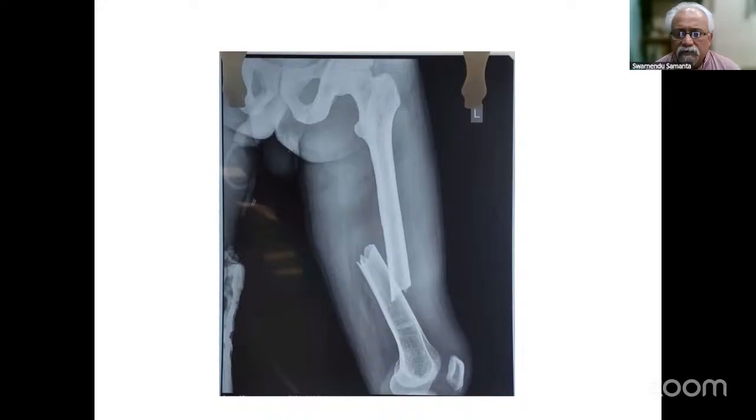Yes. That is a very good point: you must see that this is completely rotated, more or less 90° to each other. You must check the distal neurovascular status and follow the ATLS protocol. Follow this theory when the examiner asks you. But whenever you see a fracture in the shaft of the femur in a skeletally mature young person, you must get a pelvic X-ray. Otherwise, you are going to miss something.